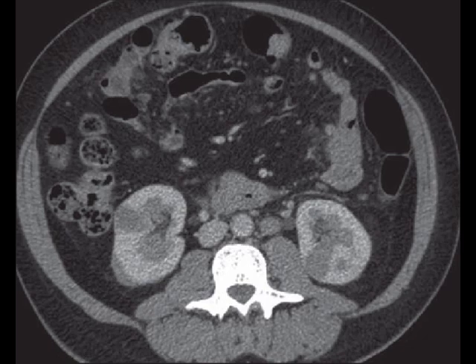You often also have associated retroperitoneal lymph nodes, but calcification is very uncommon. So your first common imaging pattern of renal lymphoma is multiple homogeneously hypoattenuating masses within a normally enhancing kidney with associated retroperitoneal lymph nodes and no calcification.